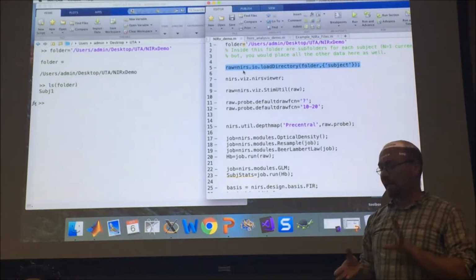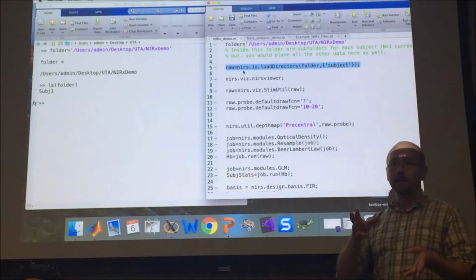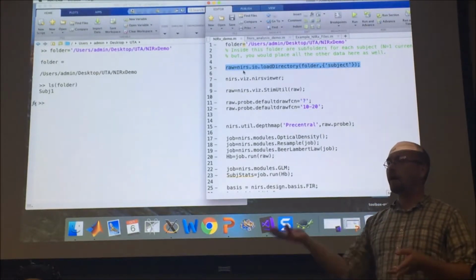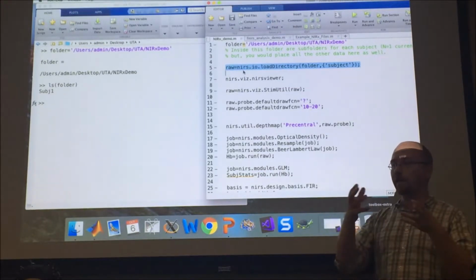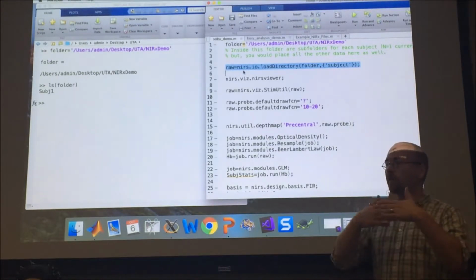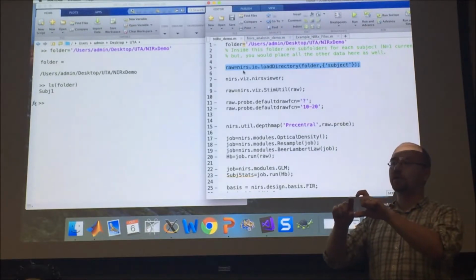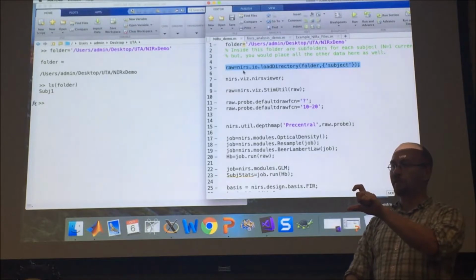when you record the data, it actually saves that whole 3D head and stuff like that. So when we load up NIRx data, I load everything. You'll see it's going to have that 3D mesh and all that registration. If you were loading up, say, 100 files, it only loads that mesh for the first file because it assumes you use the same montage for everything else.